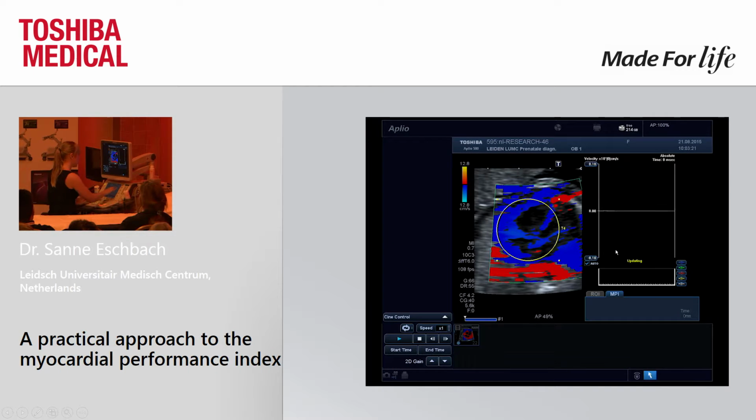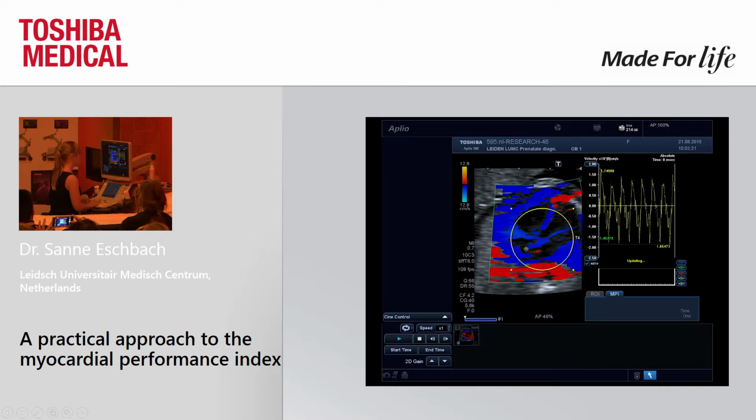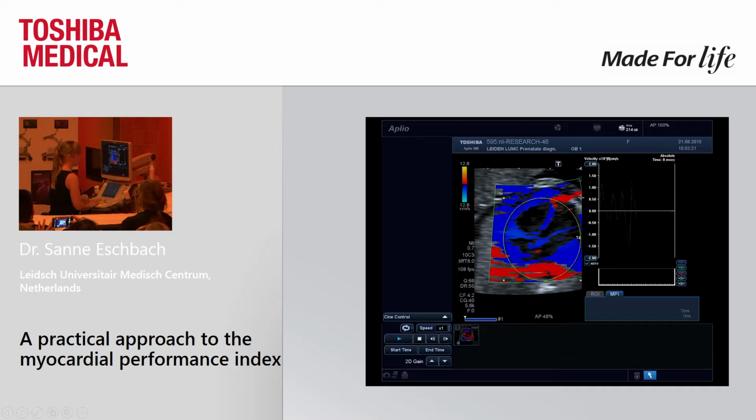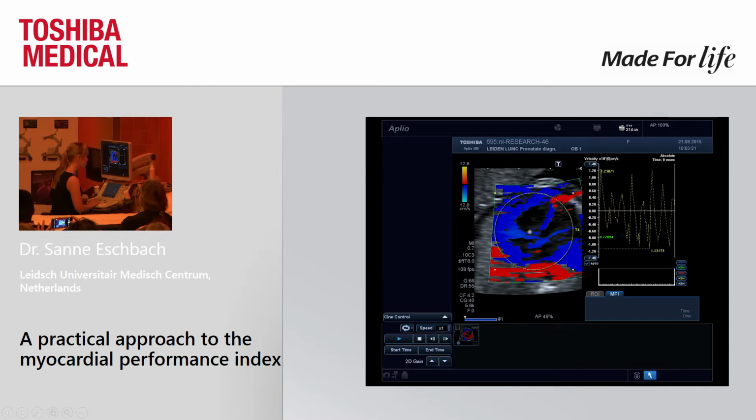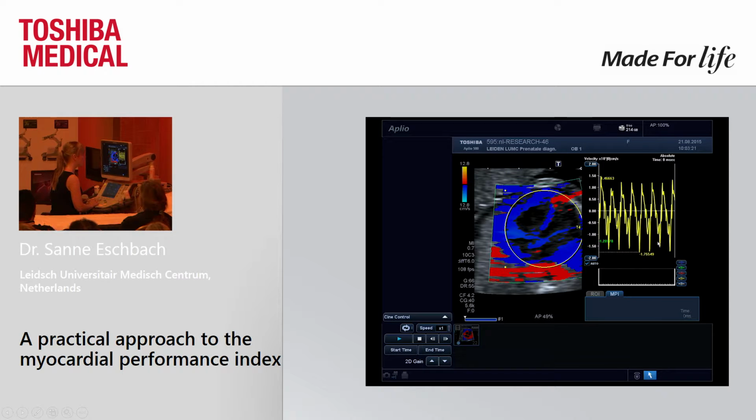So then we can go to the MPI software. This is the region of interest, and you can make it as large or small as possible. So in this way, I'll let it contain the full 4-chamber view. And you can see here that there are 7 cardiac cycles, and they're all looking good to me, so I can just choose one to highlight.